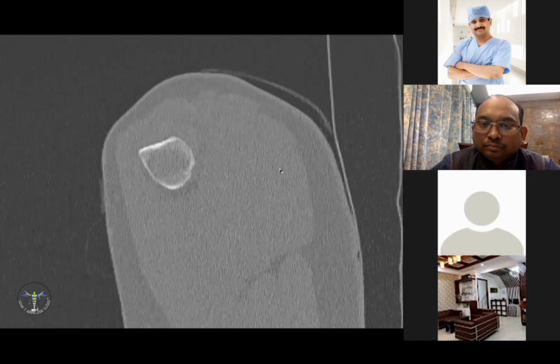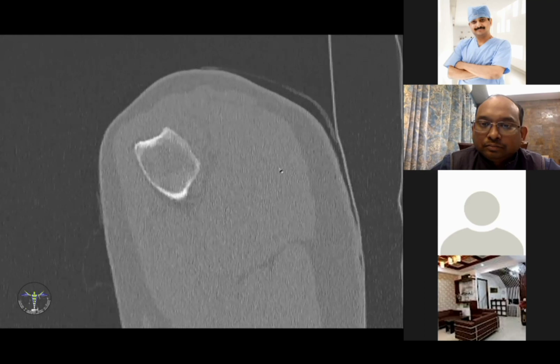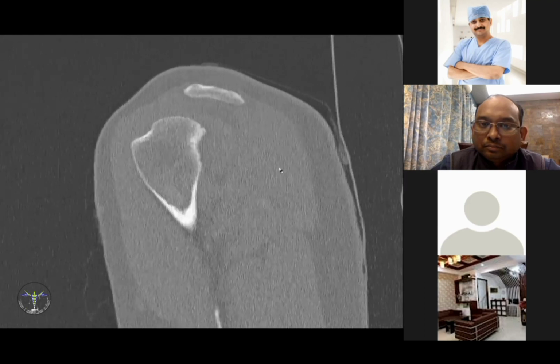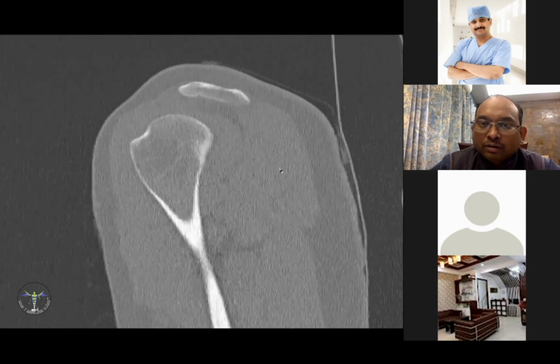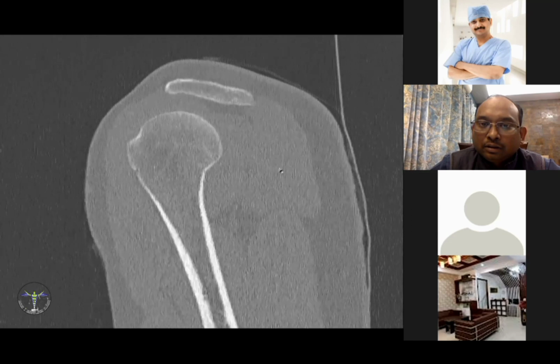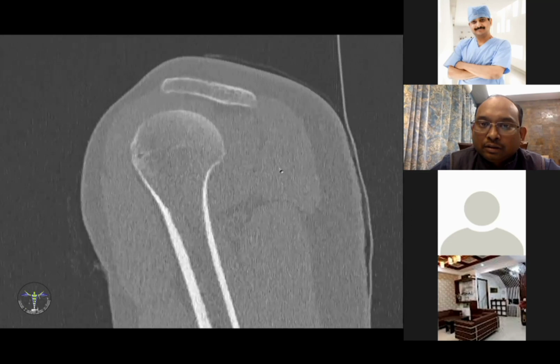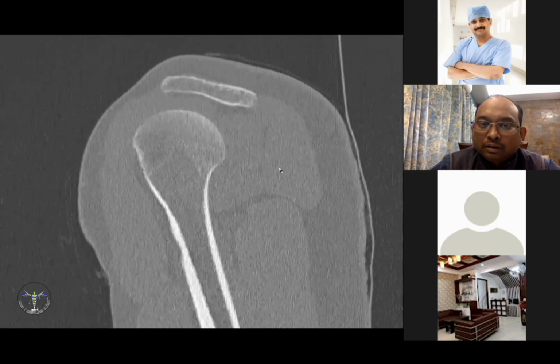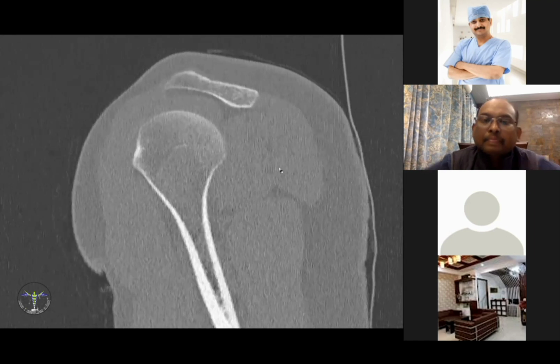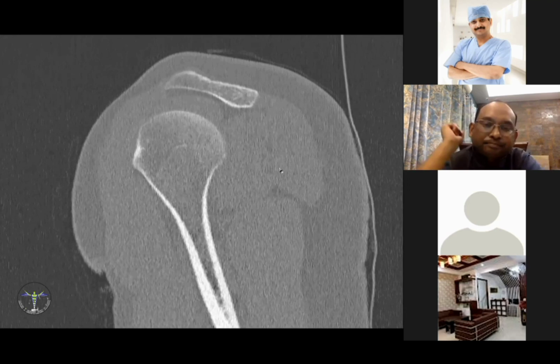I have a doubt regarding the calculation of the glenoid track. Suppose there is a defect. Whatever the size of the defect, when we draw the best fit circle, first of all we take the full diameter, that is the capital D. Then we measure the bone loss, small d.